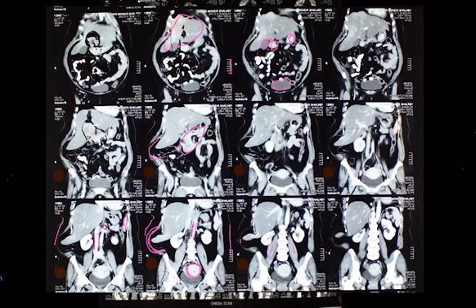Absolutely. Okay. You can also see the gallbladder. Can you see the gallbladder? انت علمتي على الجول بلادر قبل كده مش كده؟ ولا انا ما قلتلكيش؟ علمنا عليها.